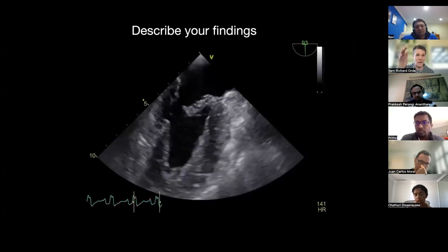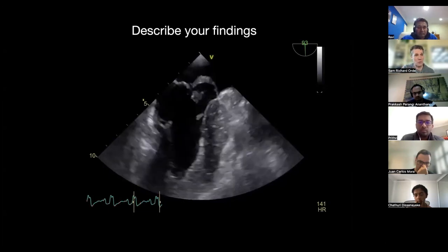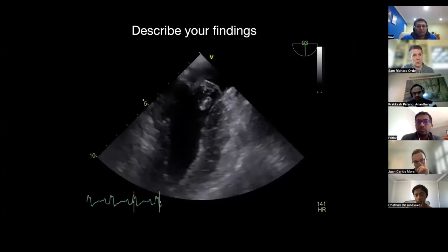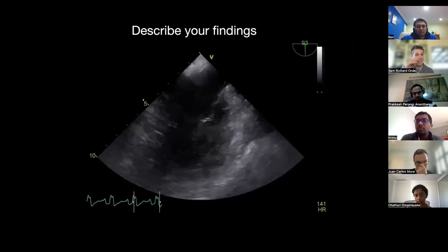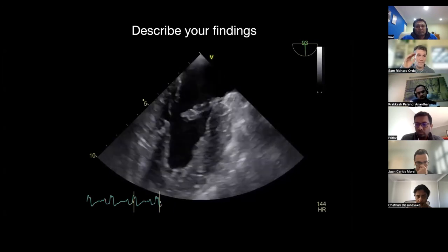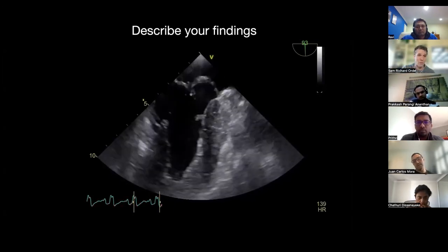And he's severely unwell in the ICU. He's tachycardic as all hell. Give me regional wall. Why has this guy got it? You didn't talk to me about the regional wall, and I'd have thought that would stick in the setting of, think broad. You've got to think broad. Don't miss the regional wall. If I'm telling you about infarcts, tell me about regional wall.